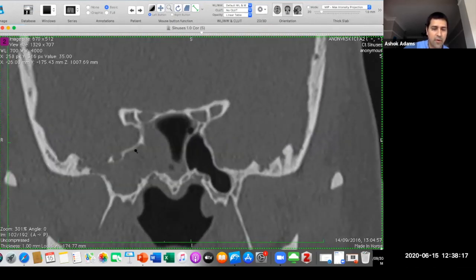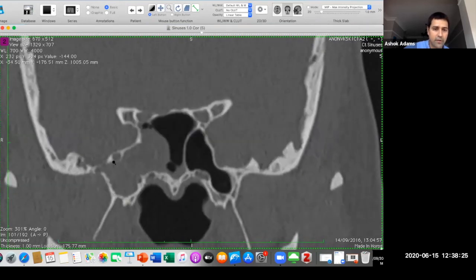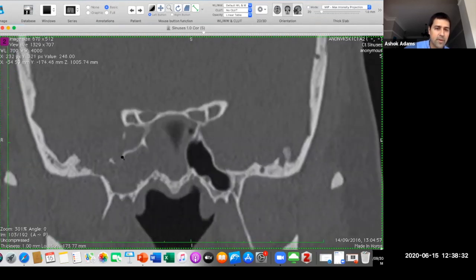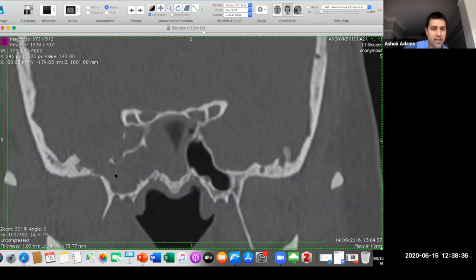And the other thing that you've probably noted now is the opacification. Where else could it come from? So always be very wary of meningoceles, meningoencephaloceles. Here you can see there's a defect in that middle cranial fossa. In terms of guiding the surgeon, if anyone's going to go and repair it, this is lateral to the pathway of that V2 nerve canal. And this is going to be a very difficult area to get into. This has snuck right up into that pterygoid recess.